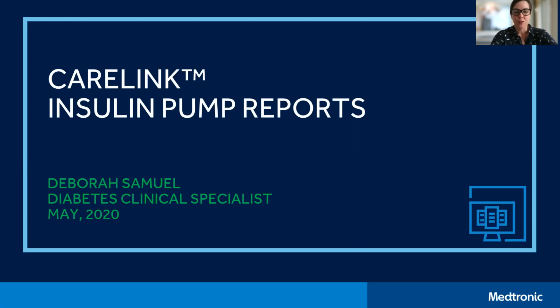Welcome to our second video in the CareLink support series, built to help you become prepared for your remote visits. In our first CareLink video, I walked you through how to upload your pump and how to generate reports. In this video, we're going to take a look at insulin pump reports only. And in our third video, we will look at reports pertaining to CGM and auto mode.